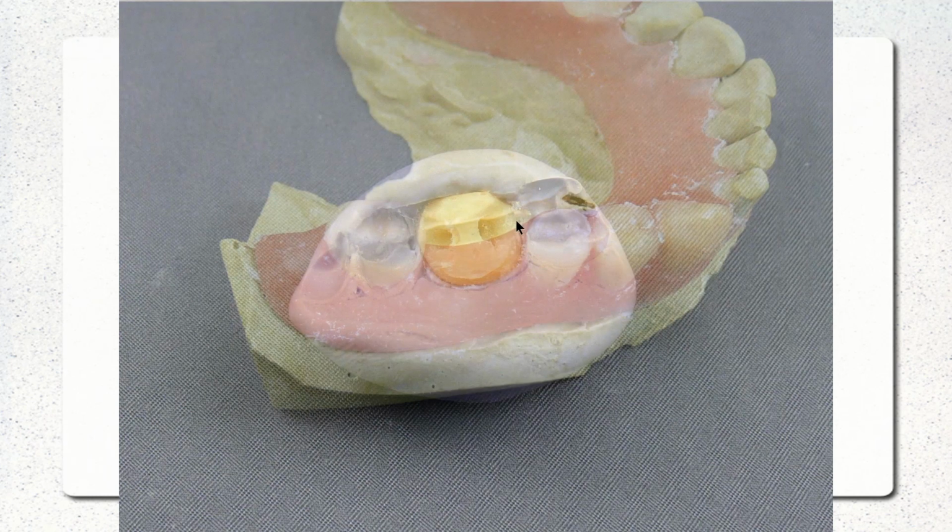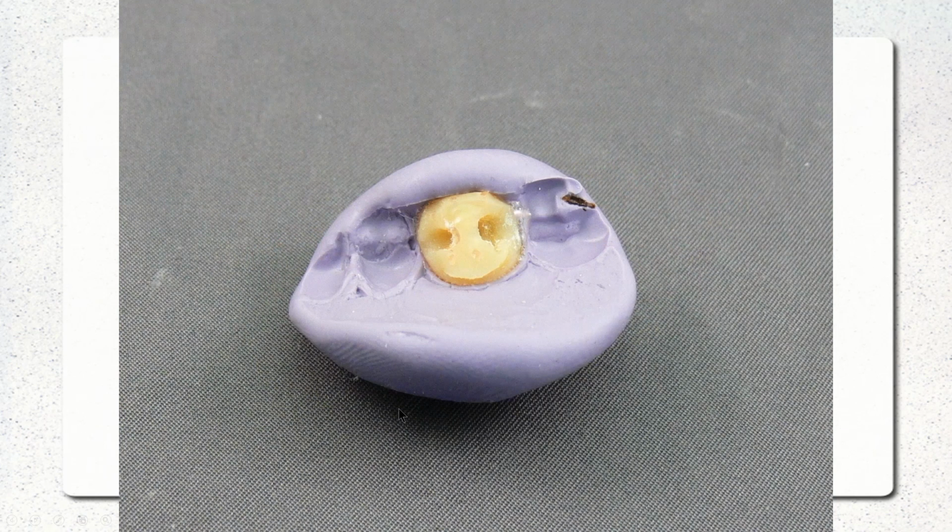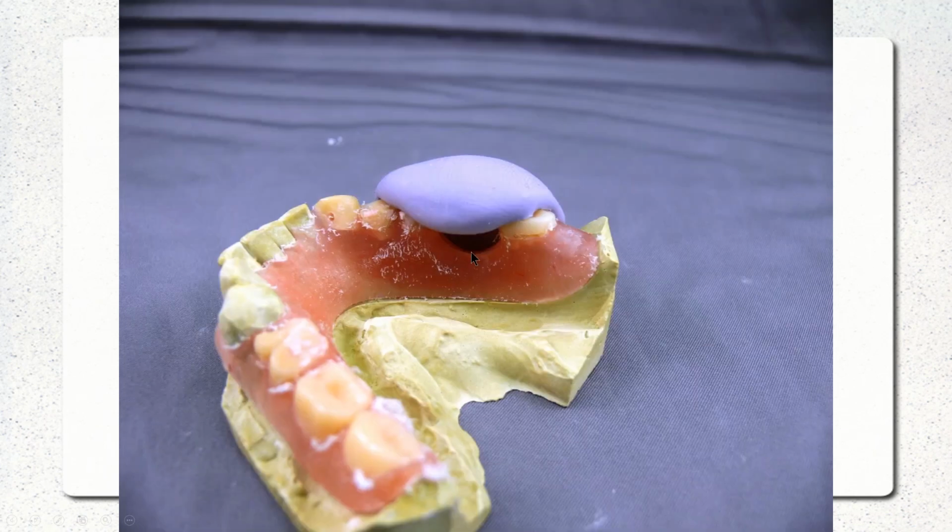We then create a little space. We want to have a little gap here so when we push this putty down into place, the material can ooze out. But we don't want it to ooze out too easily, because as it is squished out, it's also going to be squishing up into the diatorics of the teeth and those areas.